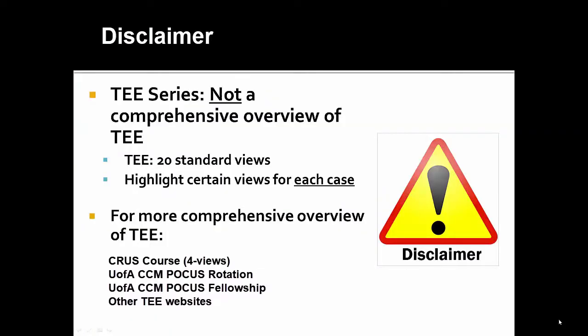As a disclaimer, this series is not a comprehensive overview of TEE, as full TEEs have at least 20 standard views, but we will highlight important views for these cases. For a more comprehensive overview of TEE, please consider the options listed.